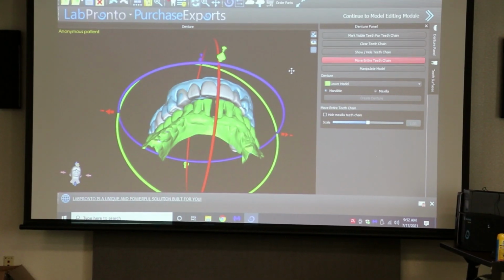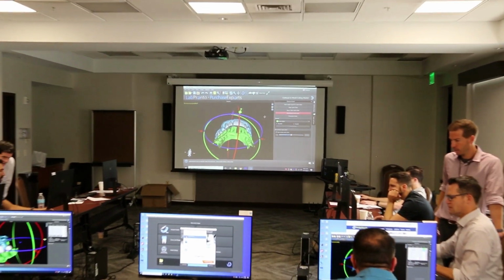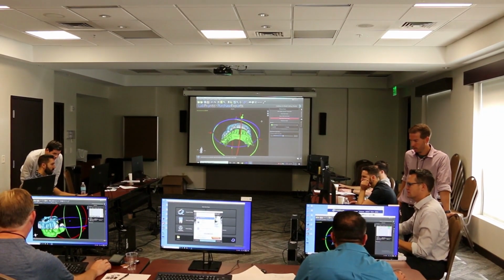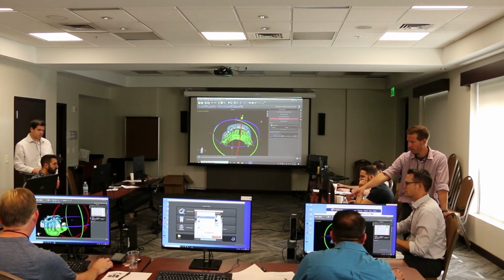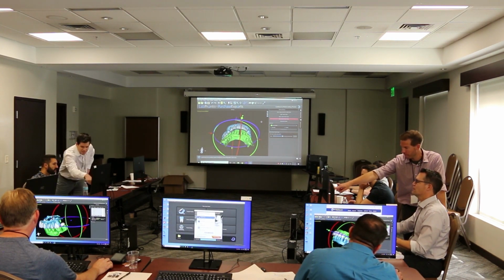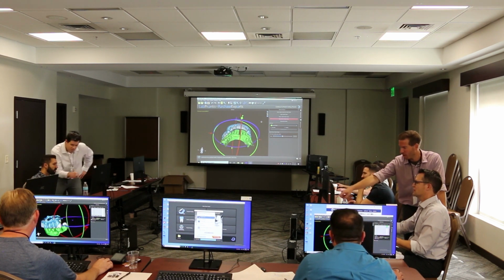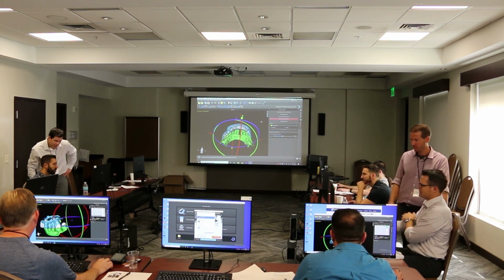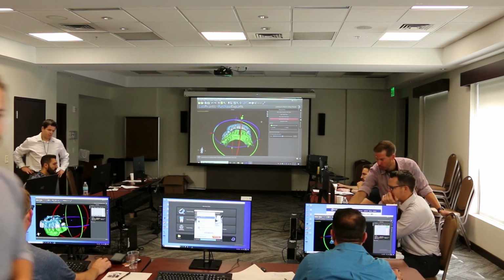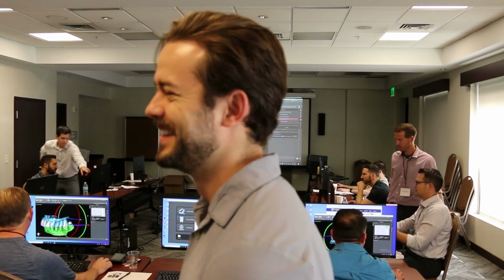Cool. So you got your upper selected, maxilla selected, dentate selected. So good. So this is where you don't want to click that. That's where you got off. So see how it's telling you it wants the midline first, and then it wants the matching point. There you go. So now look, your face is forward, that's forward. So yep, you want to do it in that order. Cool.